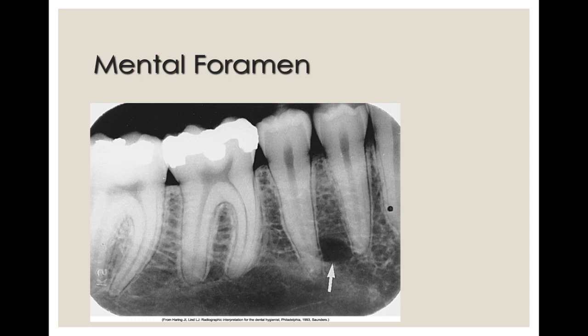You do not want to misdiagnose the mental foramen as somebody having pathosis. This will definitely upset someone, whether that be me when you're in clinic, whether that be one of your clinical instructors, whether that be in clinic next year, or especially in private practice. You do not want to be telling your patients that they have possible disease when they do not. So make sure you always know the mental foramen. And remember that the mental foramen is an opening in the bone located in the external surface of the mandible in the region of the mandibular premolars. So mental foramen, very important one.